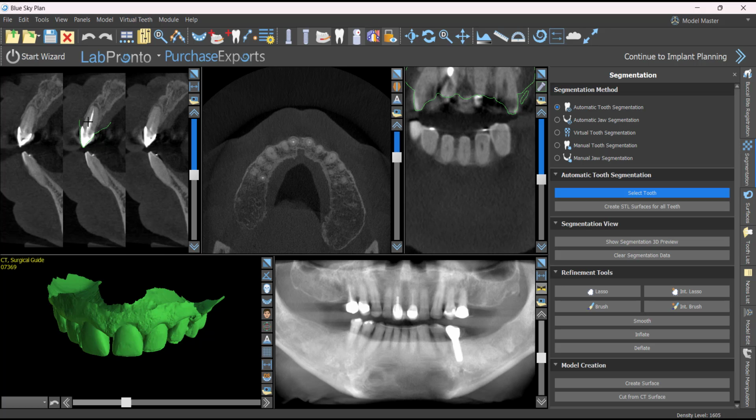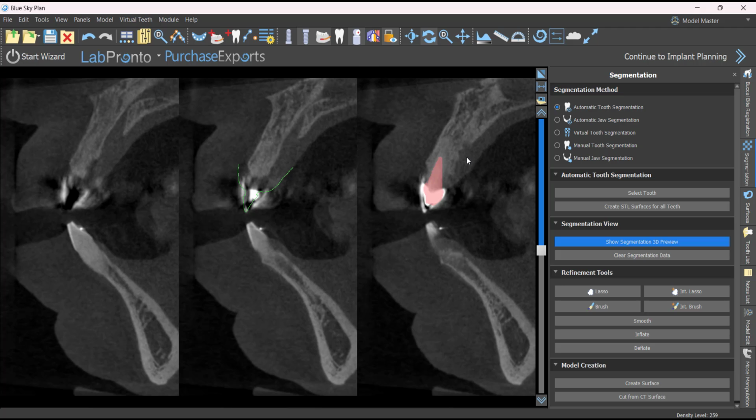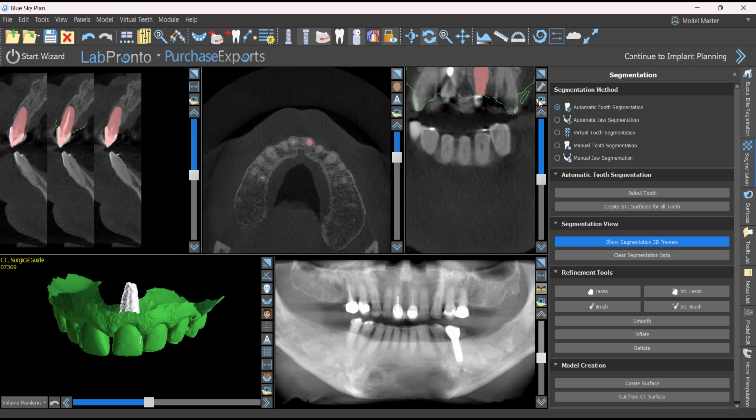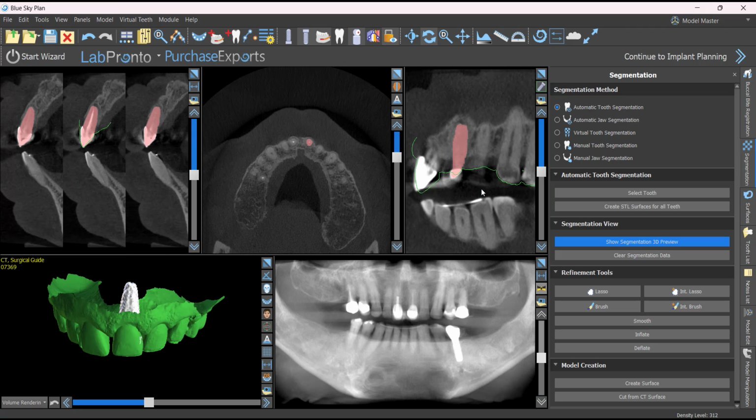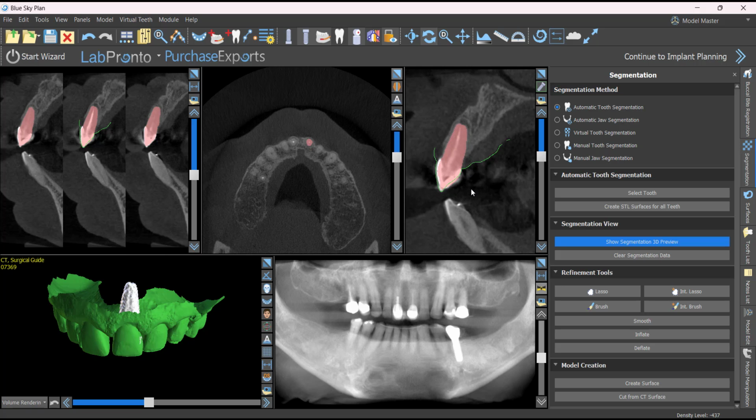and then you're going to want to come up and click in this cross-sectional window on what tooth you want to segment. All right, so if I click there, you can see that it has segmented that root, and it happens very quickly. And you can scroll through and see how segmentation did. We can look at it in the tangential window and spin this around.